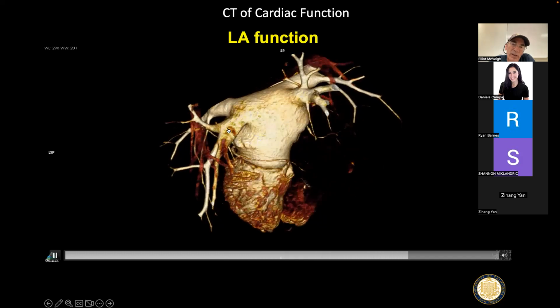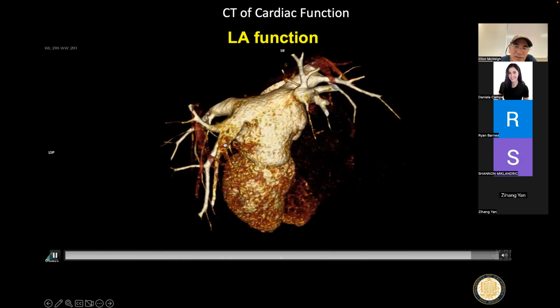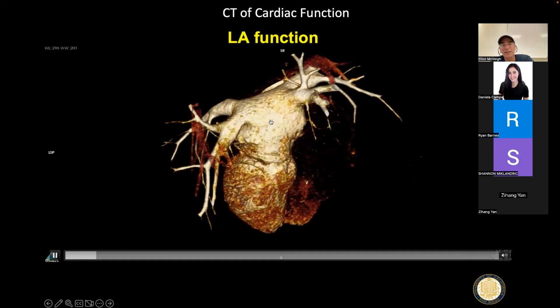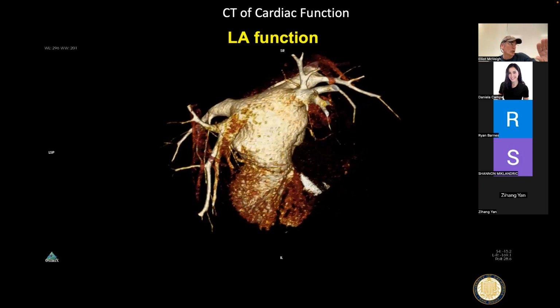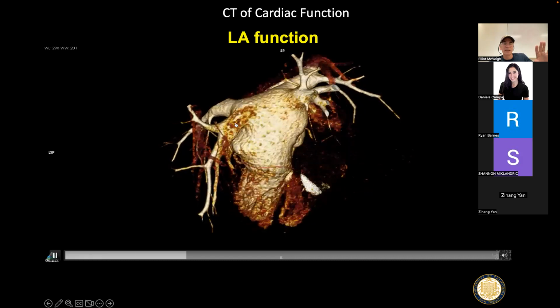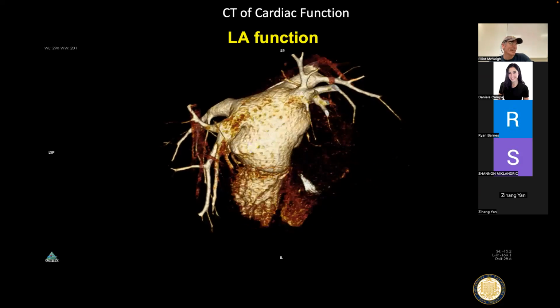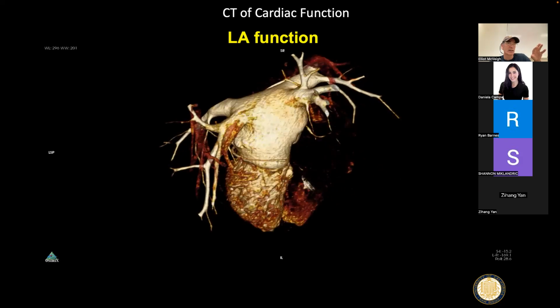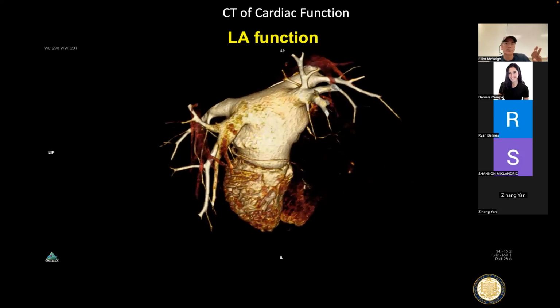If you're wondering, those of you who are really sensitive to data, you see how these dark artifacts come in this pulmonary vein here. That is the end of the contrast, basically. So the contrast coming in this pulmonary vein has a lower concentration than it did at the beginning of this heartbeat, right? And so you're seeing this flow because it's blood with far less contrast in it coming in. It's almost like the saline chaser or something coming in after it, right?